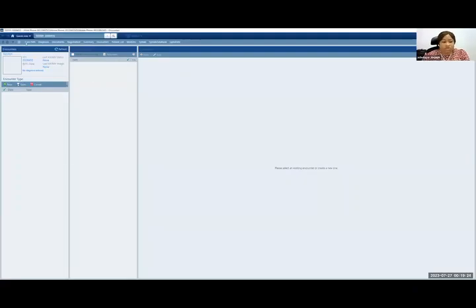And I'm going to just start on this screen with a test patient. So again, when you joined the center, you'd have received your login details to be able to access the EMR. And you would have had a preliminary orientation session of how to use the EMR. But these videos are going to just go into a little bit more detail of how to stage tumors.